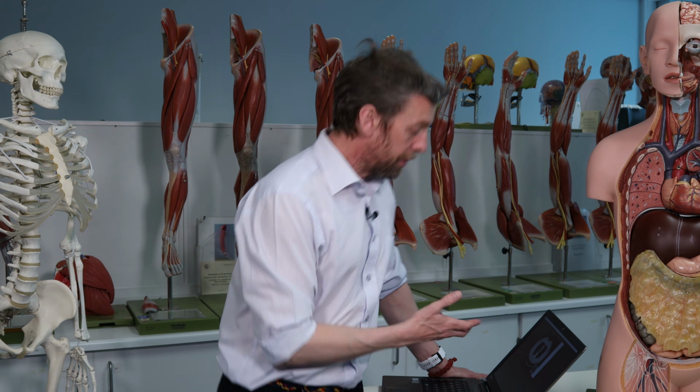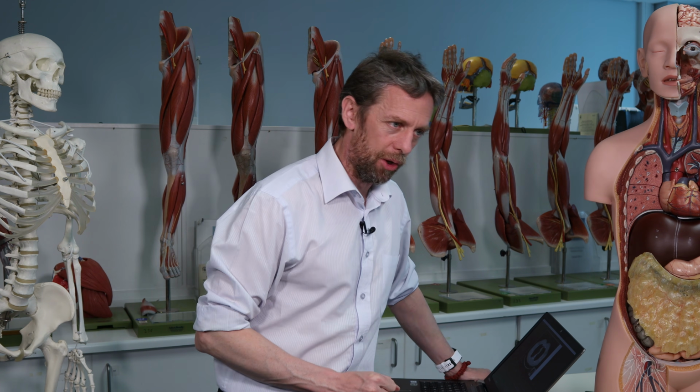All right, what's left? Well, there are a couple of things left. And you can see more on these than what I'm showing you, but I'm showing you the major structures. You know, really skilled radiologists and radiographers will see a lot more than what I'm seeing here. But we can also see the pulmonary trunk. That's another landmark sign for me. And the 2 pulmonary arteries. We might be able to see the pulmonary veins.